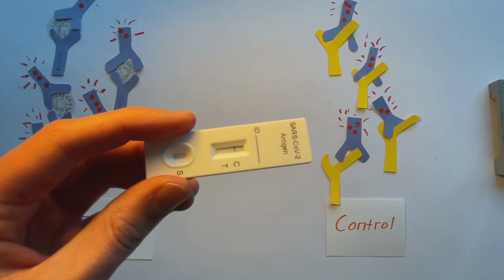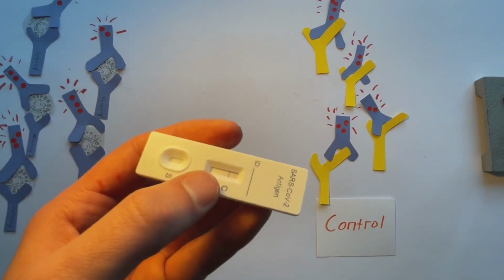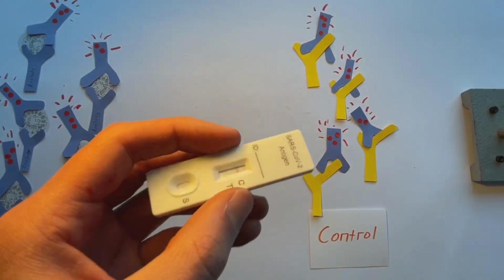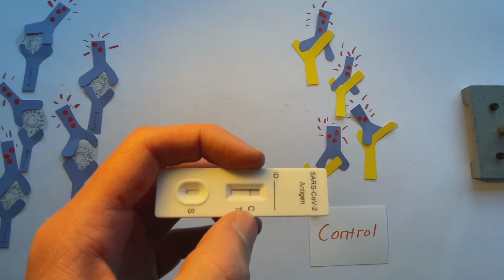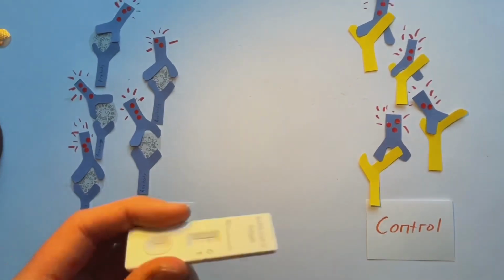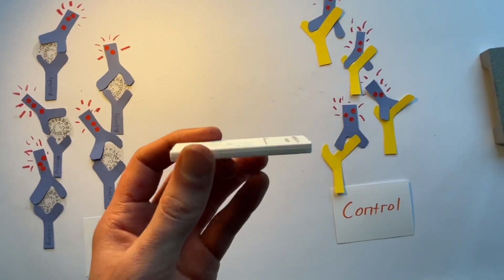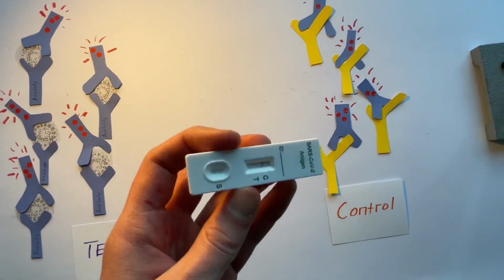So this morning when I took my negative test, that control band right there is a band of gold particles that are attached to just the normal antibodies. The reason I have the control strip is it's telling me that the strip is working like it should. There are antibodies present and the antibodies have gold on them. The only reason a test strip should show up with a red line is if there are viruses that the antibodies have attached to. This is actually an experimental setup inside of this little cassette right here.